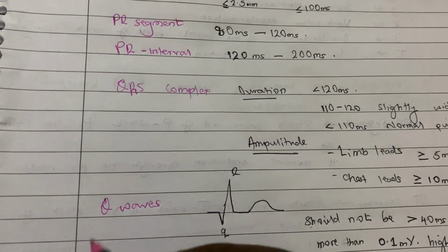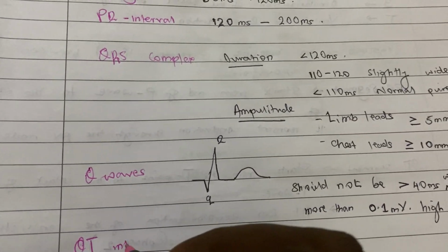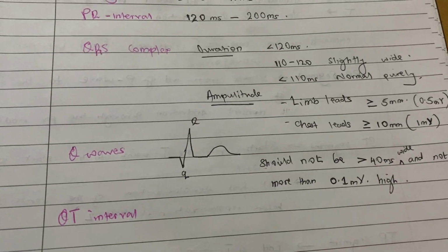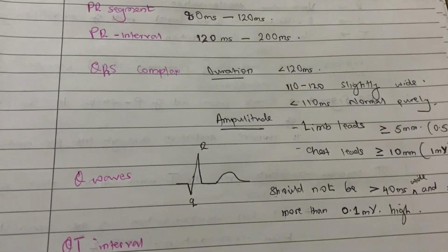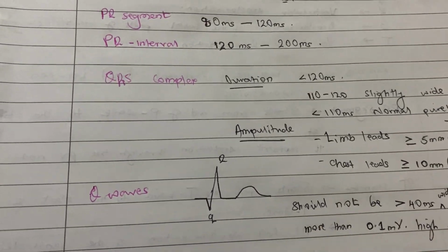Another one is QT interval. QT interval, we defined it already.